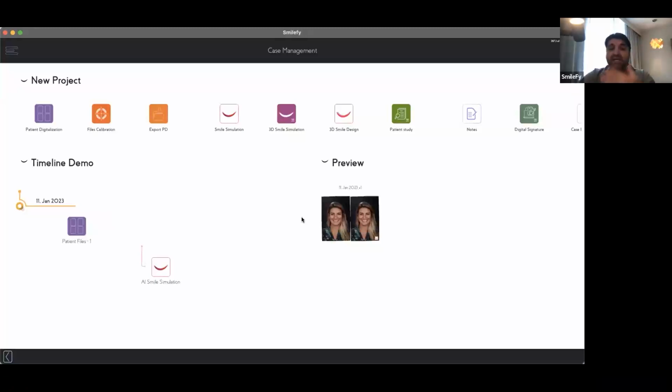In the 3D smile design, all these outlines change with the rotation and with the facial orientation. In 2D design, these outlines stay the same. Embrasures, incisal embrasures, everything changes in 3D. So the 2D smile design is not precise enough to be transformed into a 3D smile design. We have huge differences in the incisal edges and in the embrasures. That's why, purely motivational, the patient is motivated, we can go to the 3D smile design.